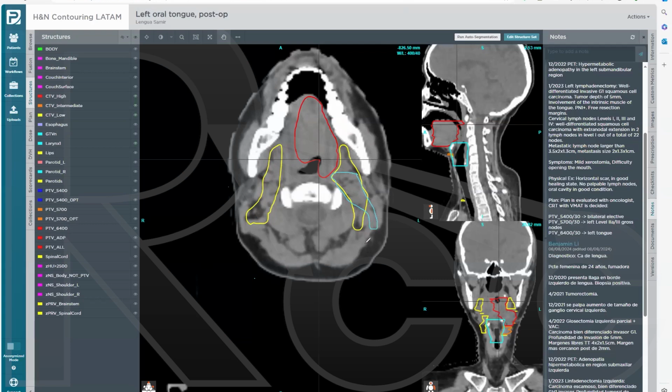It's a common mistake also when you're drawing up, and I know I'm not supposed to talk about level 2, but also just mention, thank you, that, go ahead, we are learning, is to go into the paravertebral muscles higher up, right? But the sternocleidomastoid muscle is out here, left. Okay, just wanted to kind of bring that up. And then there's a parotid gland that sits there too.